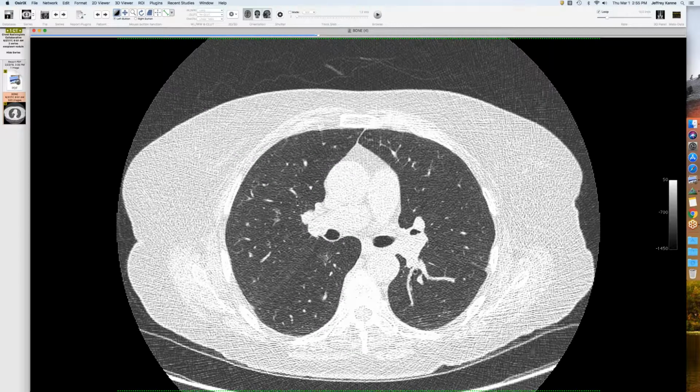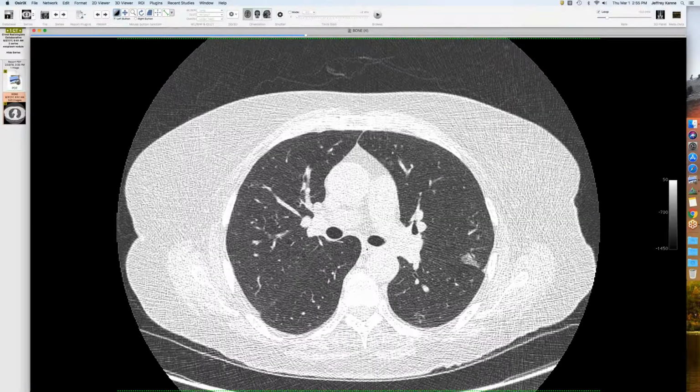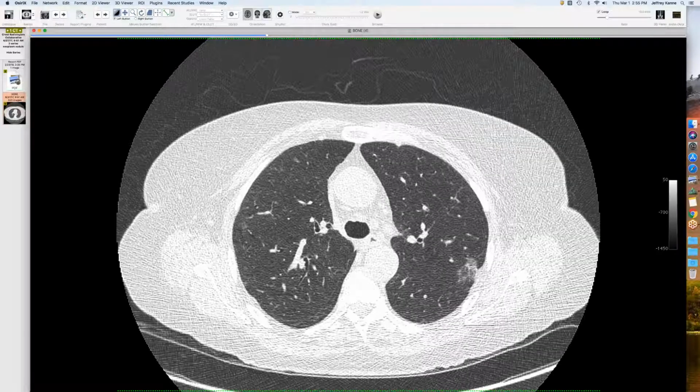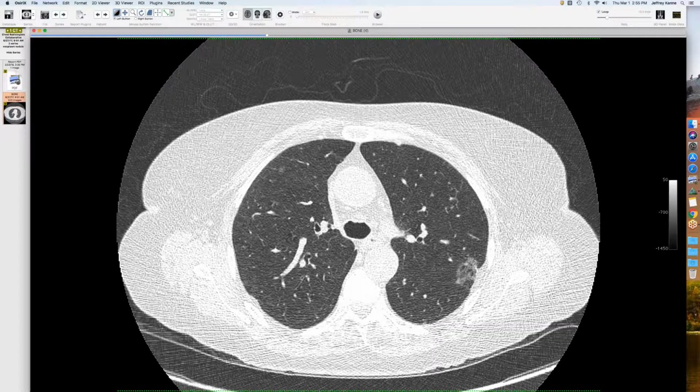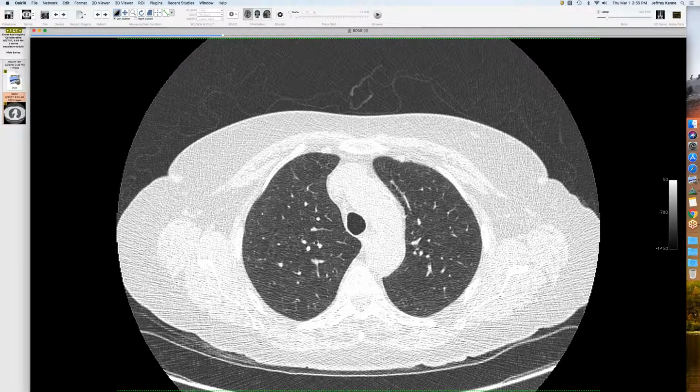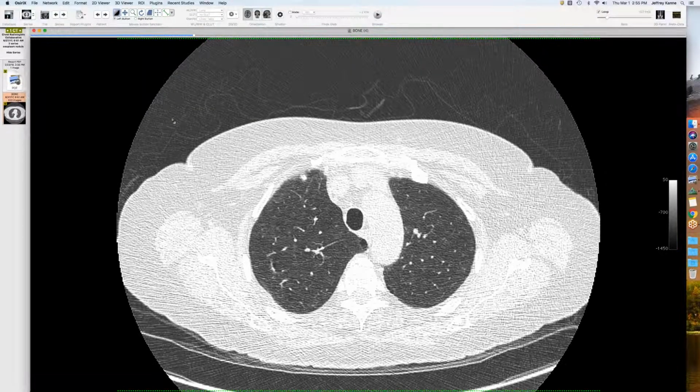There may be one here, but that one's pure ground glass, and he's got these more irregular looking things that don't have the typical morphology. This looks more to me like smoking related lung disease, but we'll have to wait and see when he gets his follow-ups.